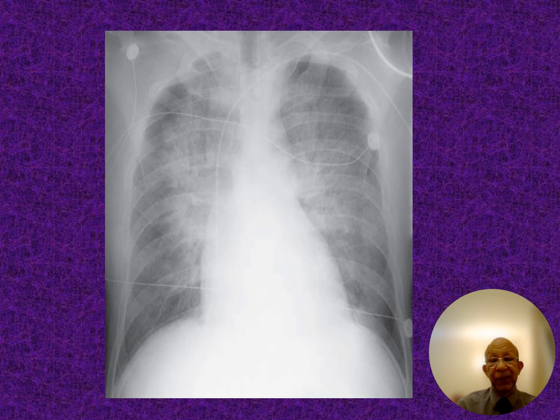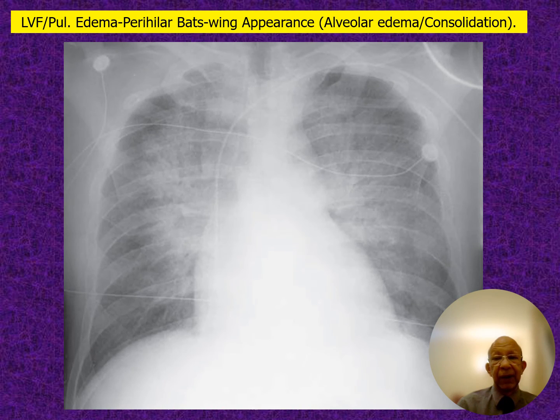Okay, so air bronchogram. Now, this is a typical picture of butterfly shadowing, and it's all about fluid in the air spaces or alveoli, and if it's gross, it can also give an air bronchogram. So it's pulmonary edema with a butterfly batwing appearance on the X-ray. Very high batwing appearance, alveolar edema, and as I said, it can even give you a feature of consolidation with an air bronchogram because there is so much fluid in the air spaces.